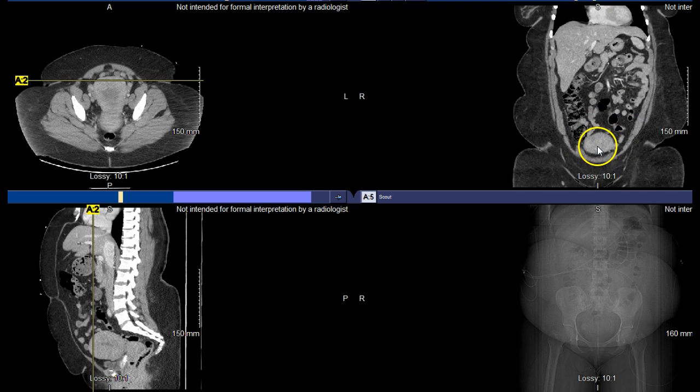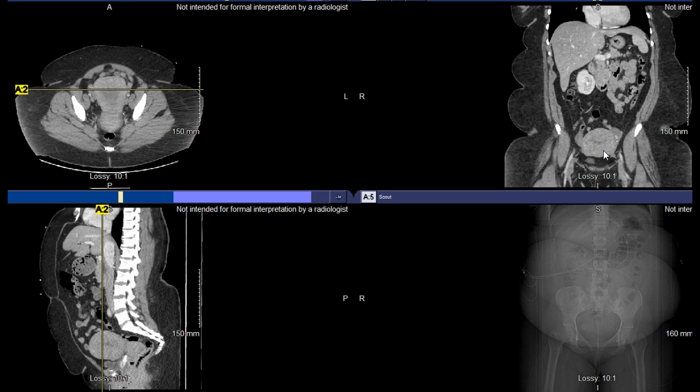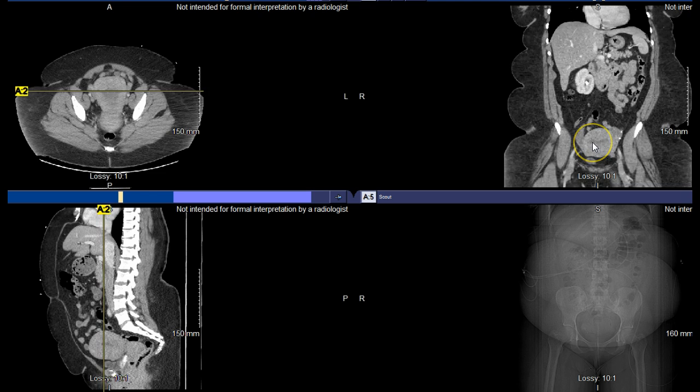What we're seeing here is that anterior perspective of the uterus itself. When we look back here, we can see the position of the endometrial area, that internal portion of the uterus. As we continue to go down, we'll get into that endometrial area, and you can see there's a little bit of a shade change there.